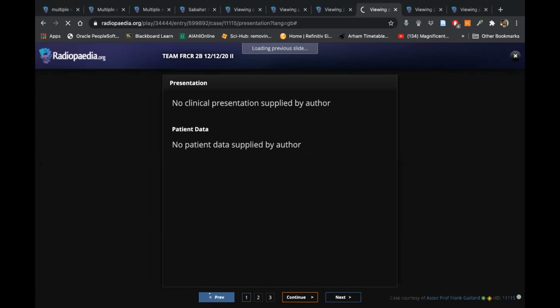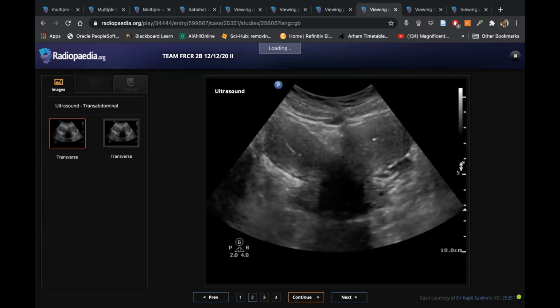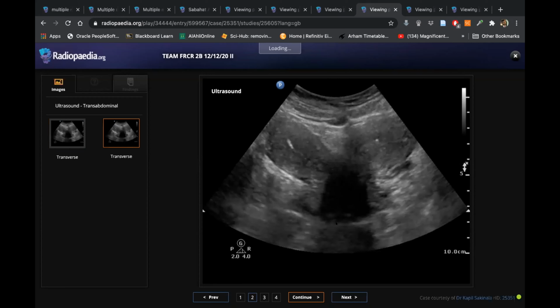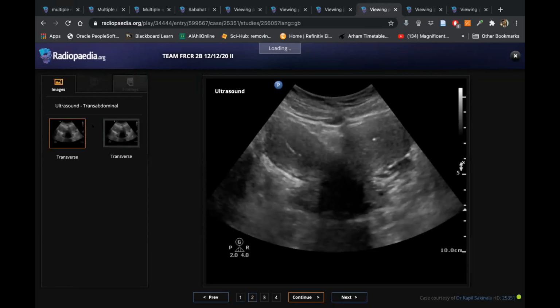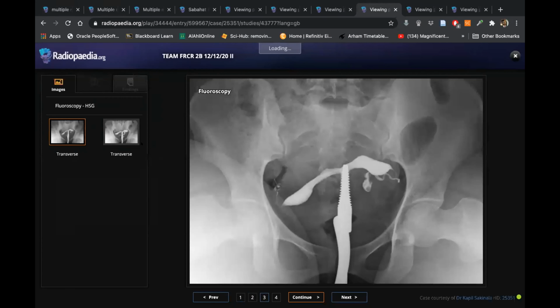The next one, I'll first show you the case itself. You did well here. When you were saying the ultrasound, the fact, what Dr. Nadeem and Dr. Maheen are always saying, that we should articulate the thought process, even if you don't see it. So although you couldn't see the cervical canal, you said it out loud, that I want to see if there are separate cervical canals or not, right? This was good. This is what we have to do in the real exams. I agree.